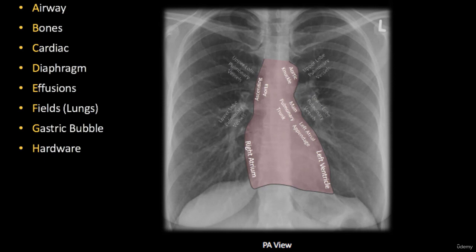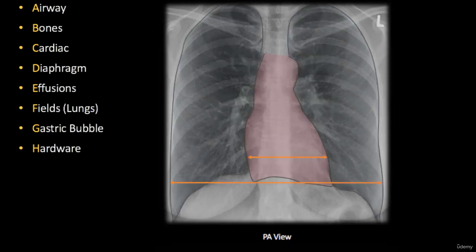Here this part of the heart may be damaged in case of trauma, and the left border of the heart is made by the left atrium above and by the left ventricle below. The diaphragmatic surface of the heart lies almost completely on the diaphragm. From here the name.